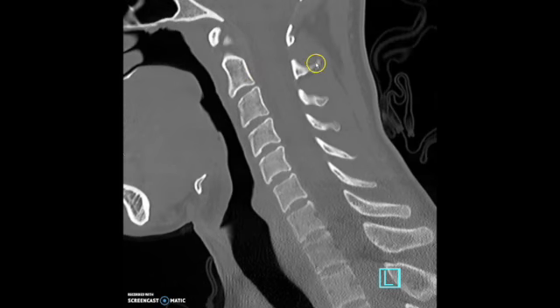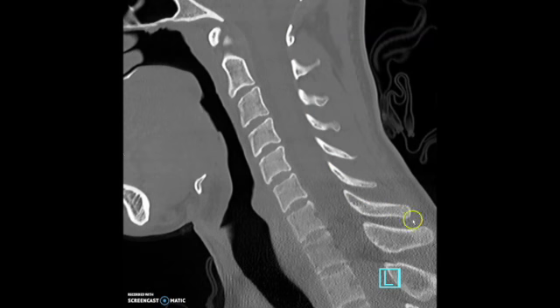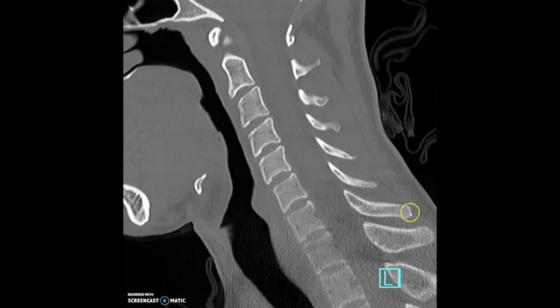But again, if you look at the cervical spine, C1, C2, 3, 4, 5, 6, 7 is the first one that looks more like a thoracic, and in this one the transition is a little bit more gradual, but you'll see that the cervical spine up to C6 has a more pointed appearance, whereas the thoracic spine has a more squared off shape, and then basically the second squared off spinous process is going to be T1. So give that a shot.